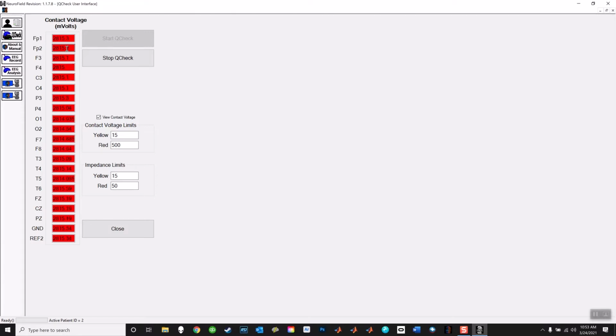Now, right now, I don't have anything plugged into QCheck, so it's showing you all the channels are impacted. All right, so if I uncheck this, this will bring us back to the kiloohms resistance.